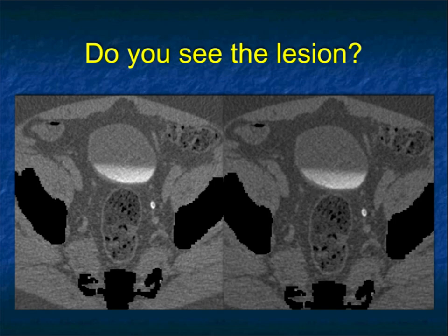Now, I do give specific talks on hematuria, on CTisus, and in renal tumors, but let me show you a few other potential points that at least I'll cover here. One is the ureter. Whenever we think about tumors of the ureter, particularly transitional cell, we think about multiple lesions. We always think of hydronephrosis and obstruction. But in this case, with a patient with hematuria, this was read as negative. I was removing the bone to do a 3D. And then I widened the window. So one thing is when you look at the calyces or the ureter, widen the window.